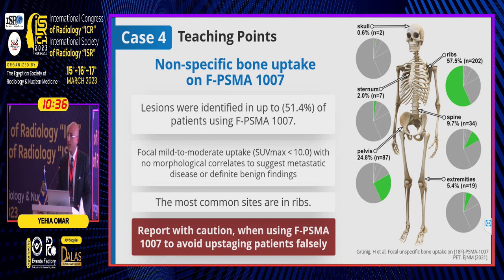So when you are reporting a case with PSMA-1007, please report with caution, because you may upstage the patient and call him metastatic while he's not metastatic. So it's a very important difference.